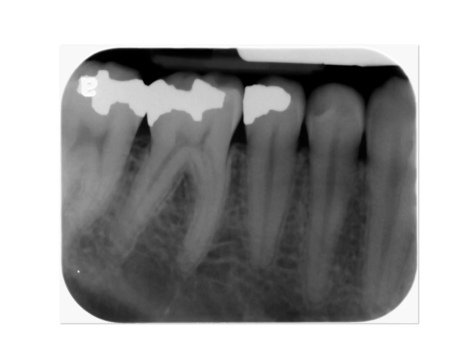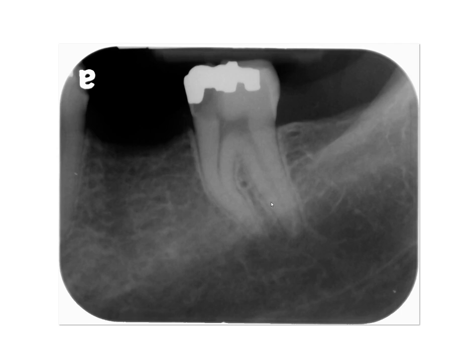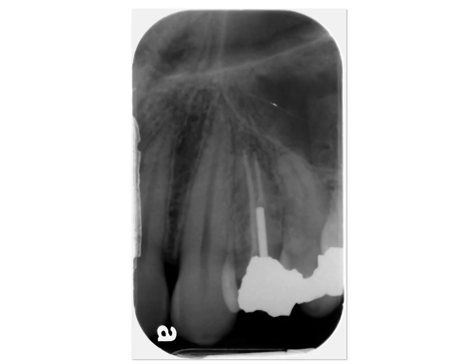So I would say that's the internal oblique ridge. So great visualization of submandibular gland fossa with the mandibular canal cortication. To me, this is the internal oblique ridge, since that's the border of the submandibular gland fossa, but also here's the external oblique ridge. Again, nasal aperture and floor of the maxillary sinus.